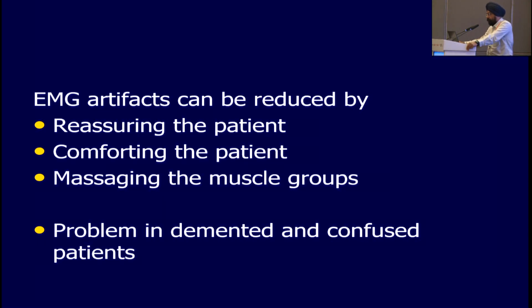So these artifacts can be reduced by reassuring the patient, comforting the patient, and massaging the particular muscle groups which are tight and which the patient has held. However, in ICUs, these things sometimes are not possible because you can get a lot of these artifacts in confused patients, demented patients.